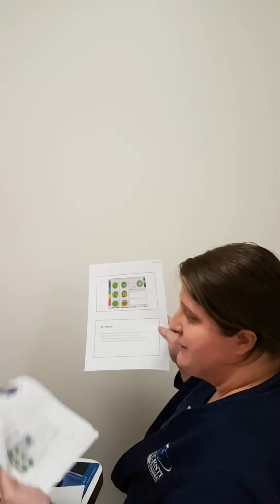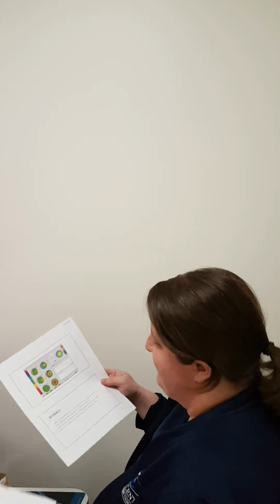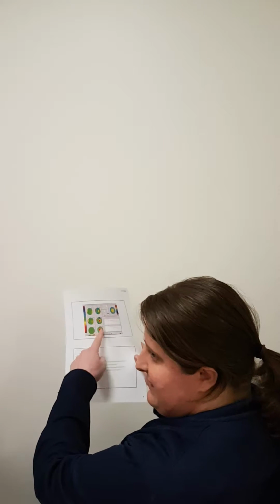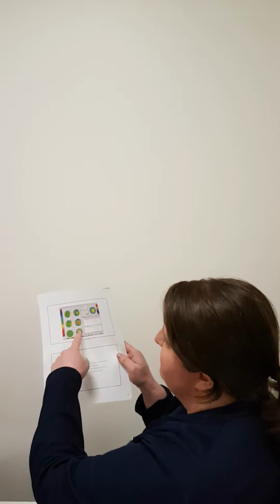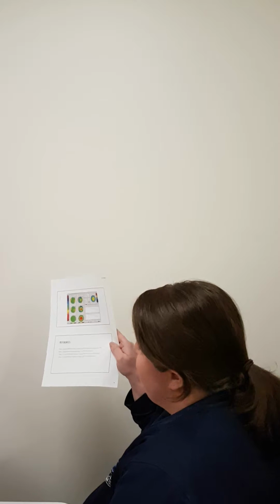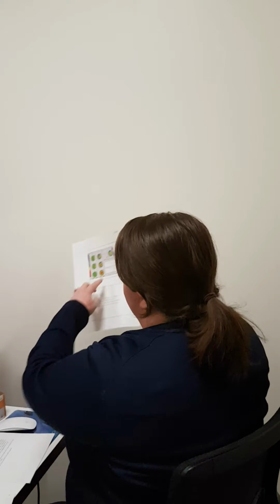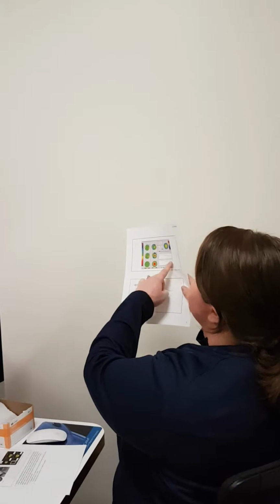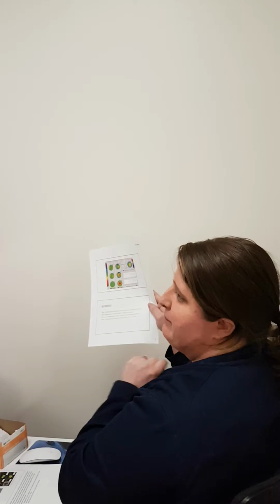You can look at the two maps, normal versus abnormal, and you can see, hey, they don't look the same. You're looking for those red areas in the center, or it can be offset, but basically it's telling us, hey, look at this, this is not normal, okay? So it's pretty easy to look at and go, that's probably something I should draw the doctor's attention to, okay? It also does, again, curvature and thickness for a normal cornea for a person of that age, with those nice little maps for the doctor as well, okay?